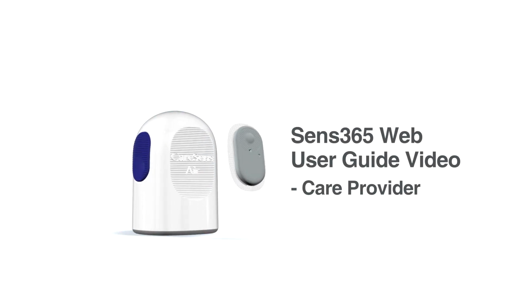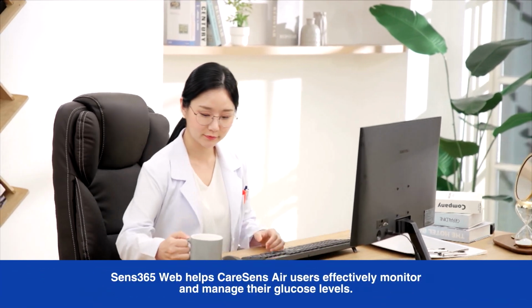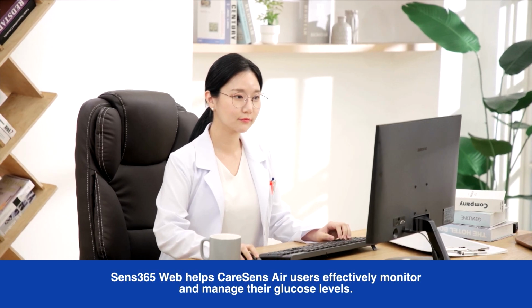Sens 365 Web User Guide Video for Care Provider. Sens 365 Web helps CareSens Air users effectively monitor and manage their glucose levels.